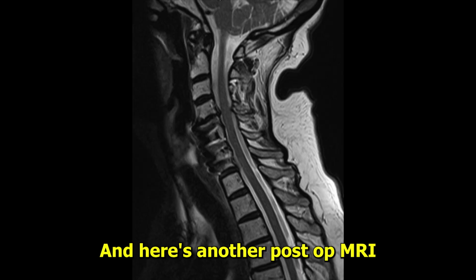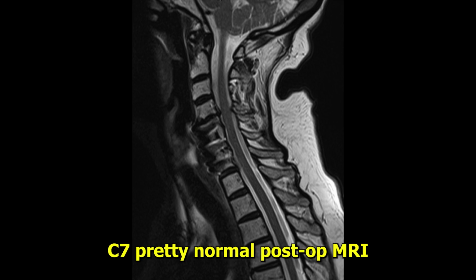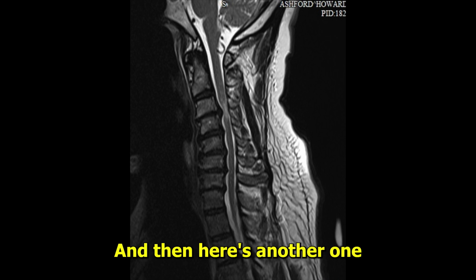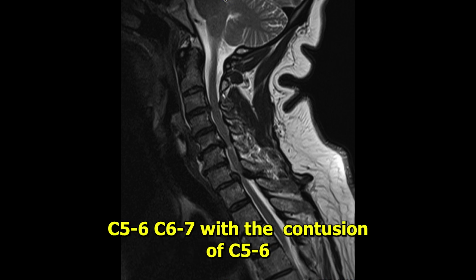And here's another post-op MRI. Patient had a fusion C5 to C7, pretty normal post-op MRI. And another with C3-4 with a large spinal cord contusion. Person's going to need surgery with a spinal cord at risk. And then here's another one with multi-level disease, C3-4, C4-5, C5-6, C6-7, C7-T1 with a contusion adjacent to C5-6.